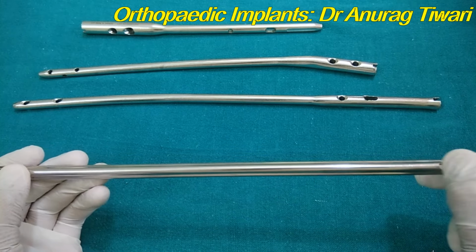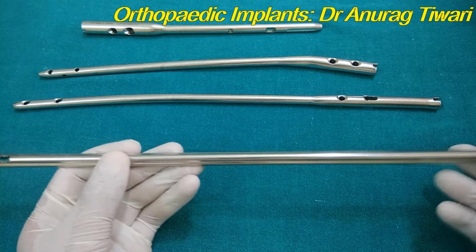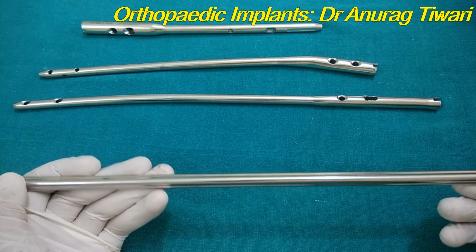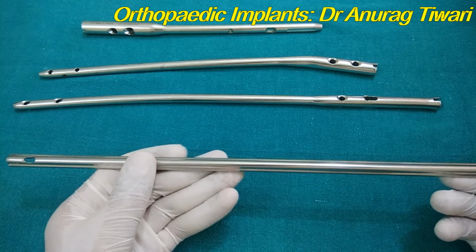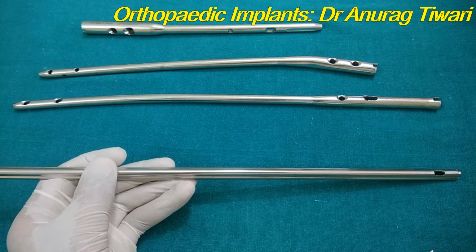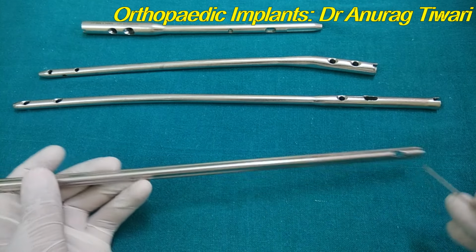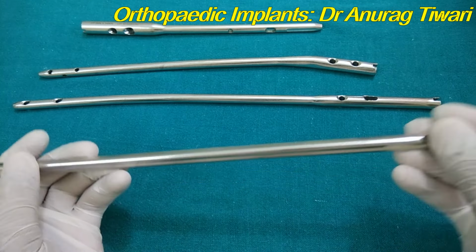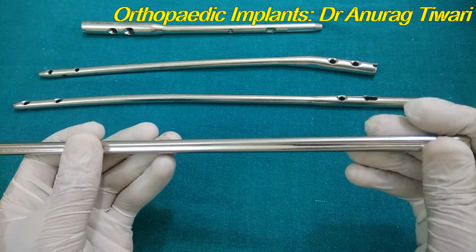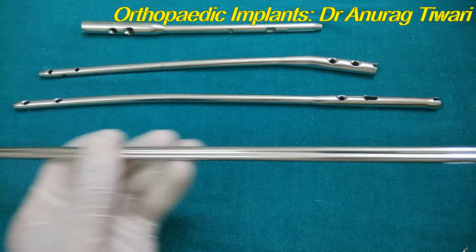There is one eye at this end and another eye at this end. The basic function of the eye is to remove the implant. It is used for the removal of the implant. So if you are inserting this nail, why are there two eyes? Again, the examiner will ask you why there are two eyes, one at this end and one at this end, because you are going to remove from one end. If this is the greater trochanteric end or the proximal end, and you are doing the implant removal, you just attach the hook over this eye and you will extract this.